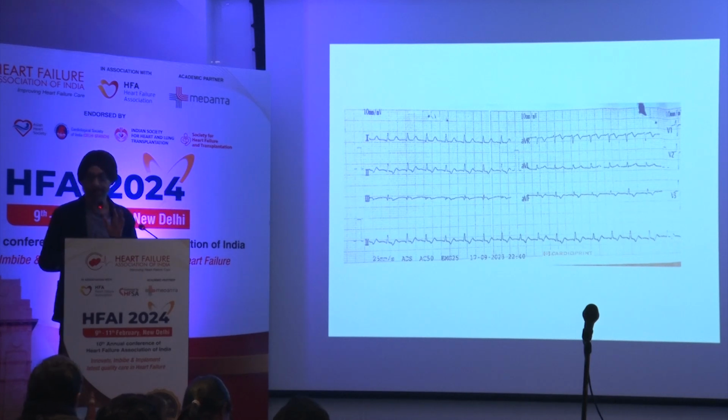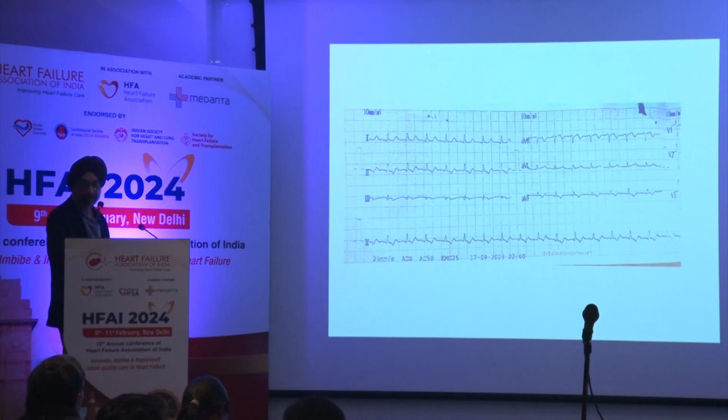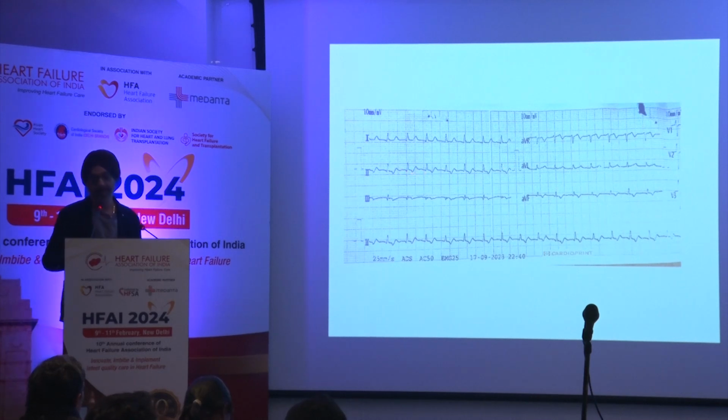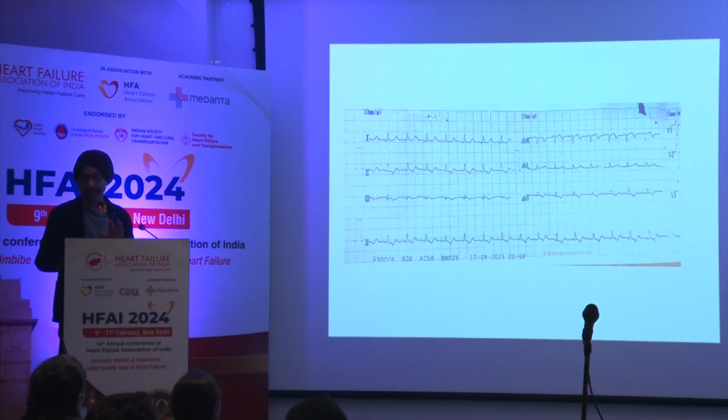Okay, so this is how AVNRT. The second diagnosis will be a concealed AVRT, concealed pathway. That this is a retrograde P, and the RP is shorter than the PR, right? And the third differential diagnosis is that it's an atrial tachycardia, that the P wave is here and then it's conducting with a long PR window. Okay. So these are the three differential diagnoses of this arrhythmia.